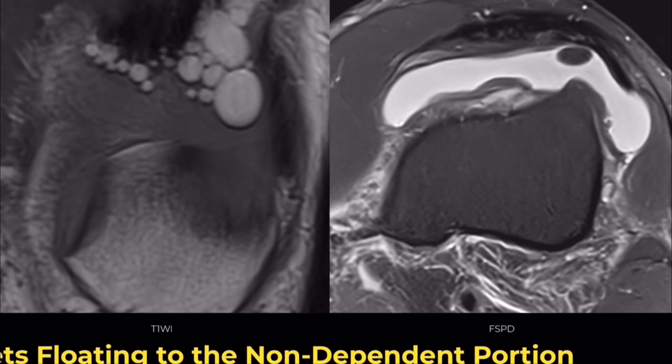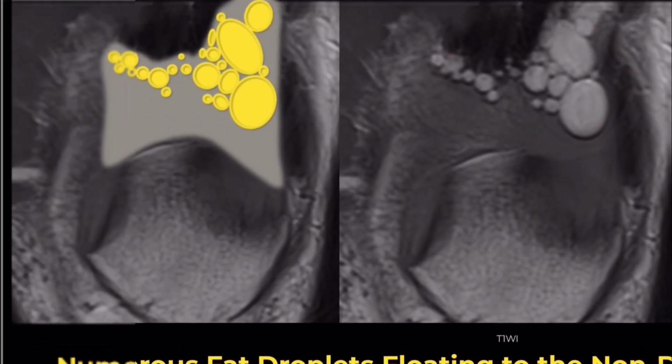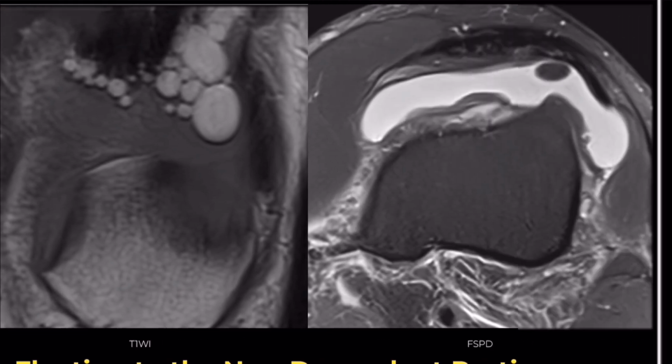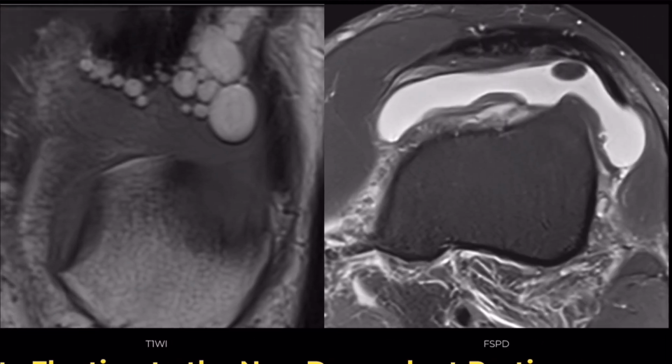In the non-dependent portion, we see numerous round to oval shaped lesions. You might wonder, is this also intra-articular gas? To determine this, let's examine the signal intensity.